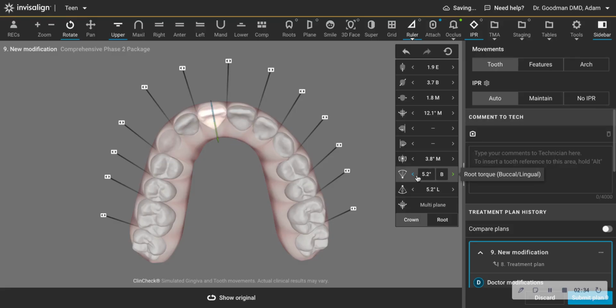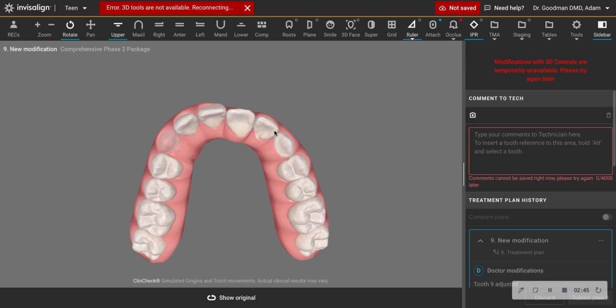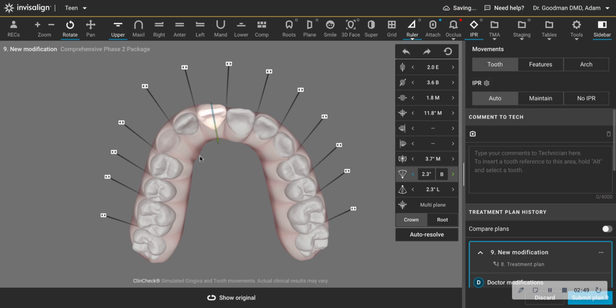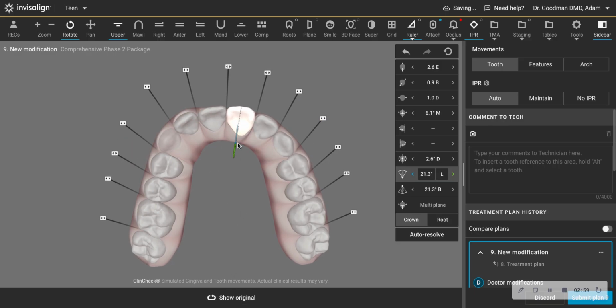All right, for some reason this is not responding. Let me undo that. There we go. This is too much here.